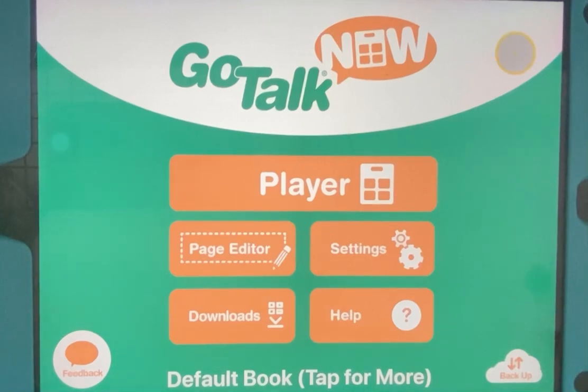Hi, today I'm going to show you how I use Go Talk Now in speech and language teletherapy.